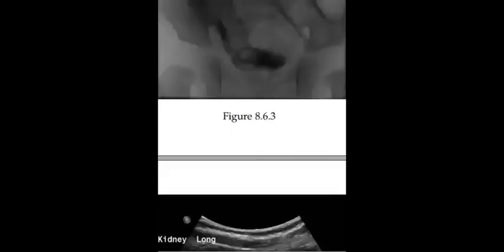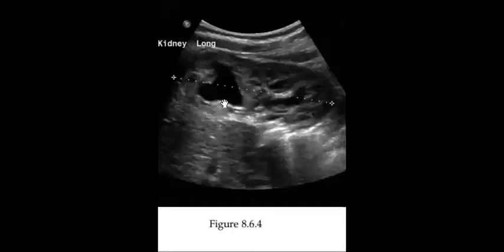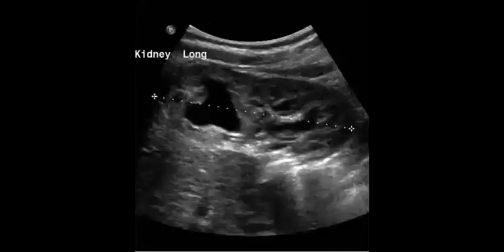So that's why the upper moiety is prone to have, or more common to have, what is called the ureterocele and the obstruction, as in this case. As you see, in this case, it is the upper moiety that has the obstruction, right? So the upper moiety is more prone to have the ureterocele because it goes in ectopic position.